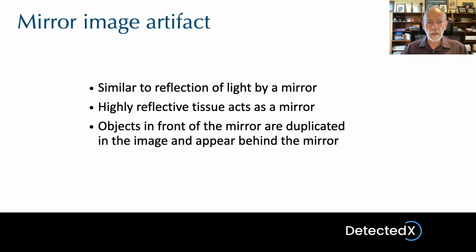If you think about an optical mirror, the mirror in your bathroom, if you're standing 1 meter in front of that mirror looking at the reflection of your face, the face appears to be 1 meter behind the mirror. We don't normally think of it that way, but it's exactly the same as what is happening here with the ultrasound. The mirror image is going to be displayed deep to the reflective mirror.